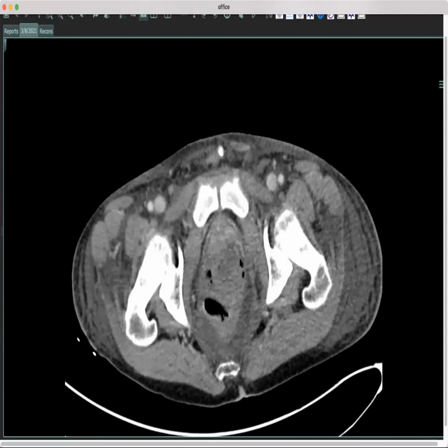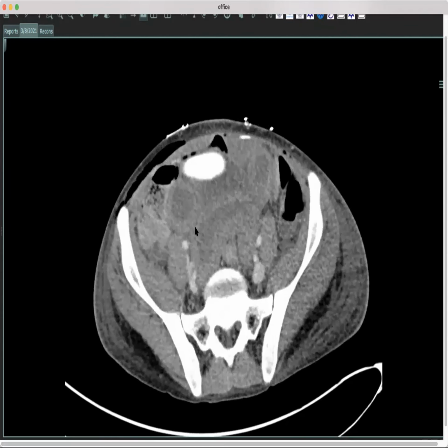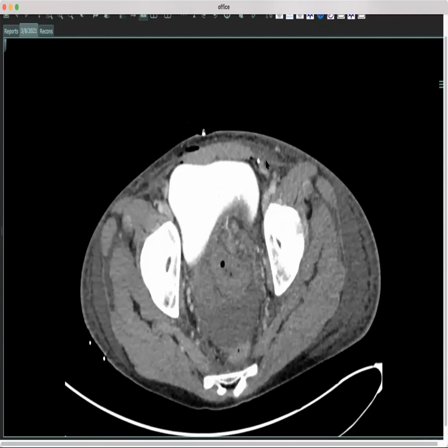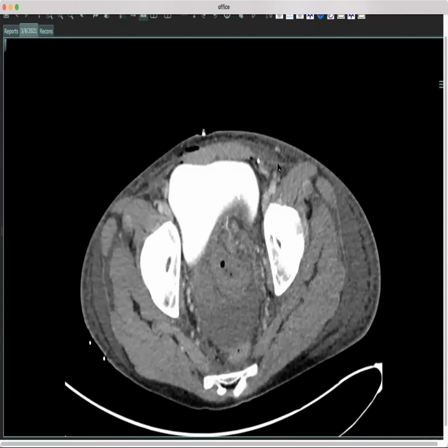We talked about the case. I realized that this was a neovagina ileal segment. And I basically said, this looks really sick and possibly ischemic. It's got all this bowel wall edema, mucosal edema. And then when we talked a little bit, we also found out that the Doppler signal had basically gone from the epigastric, or at least the venous supply had. And then we went to surgery and resected this, and it was completely dead.